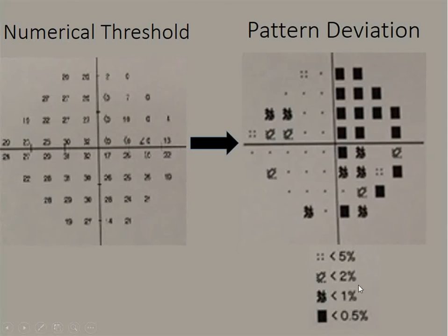Sometimes students will make the mistake of looking at a map like this and assuming that over here, because it's black, this means that the patient couldn't see at all, that it's 0. That's not the case. It's just saying that the machine's highly confident that it was abnormal. For example, here we see that there was a score of 13. The patient does see there, but again, the machine is saying that it's extremely confident that the vision in that area is highly abnormal.